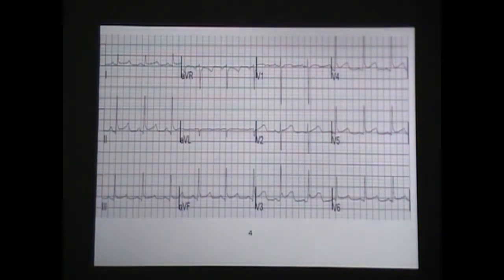Mm-hmm. So I wish I could give you a clear clinical picture, but as soon as I saw that, I go over here and look, and I'm a little suspicious. This could possibly be a left main that is affecting the LAD and the circ, and it's a left-sided dominant heart for the circ. Okay, so I would give it a diagnosis of that.